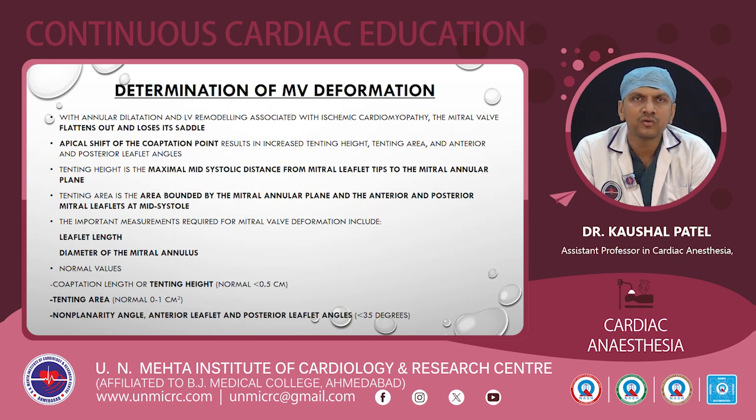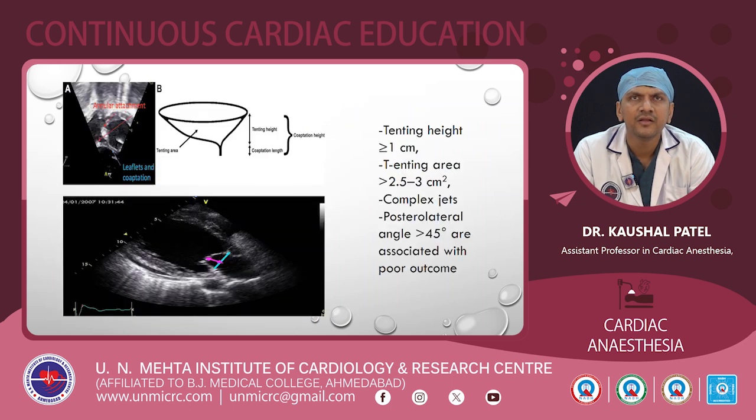So, the coaptation length or the tenting height is normally less than 0.5 cm. The tenting area is normally 0 to 1 cm square, and the anterior leaflet angle and posterior leaflet angle are less than 35 degrees.